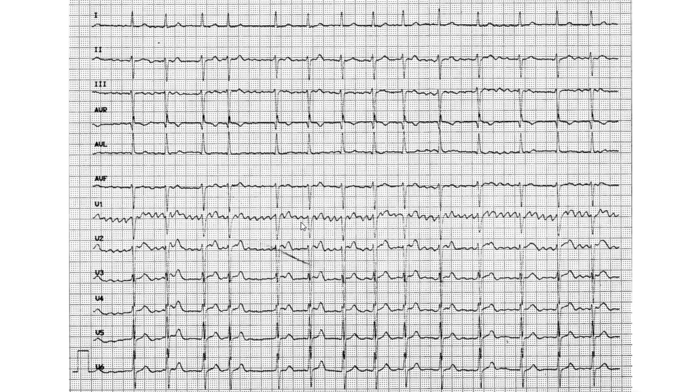If you confuse fibrillation and sinus rhythm, then you've got a big problem actually. They're not robots, but they are teachers, and they're harsh teachers if you make a mistake like that. So watch out for that point. Okay, so that is the FF business, the fibrillation business, the flutter business.